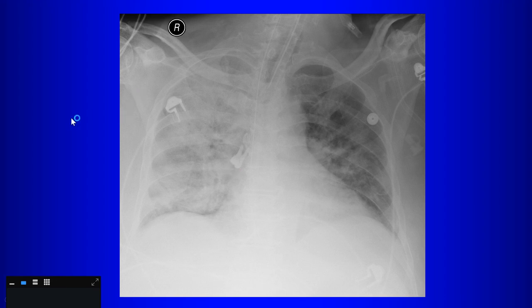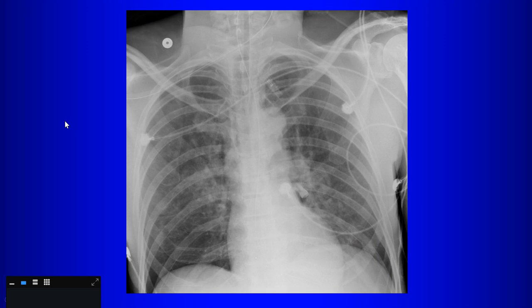Now that you're familiar with that, if I show you this, where? In the left main. Yeah, there's another tooth in the left main bronchus, right? So we're used to, on radiographs, kind of overlooking all these densities over the chest, because we look through the leads, we look through all these devices that are overlying the chest.